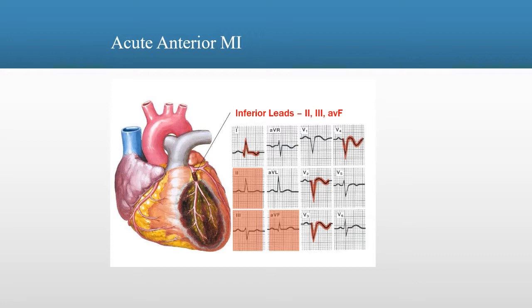Before moving on, let's look at a systematic approach of reviewing the 12-lead EKG. We will always look at the inferior portions first, then we will look at lateral, septal, and anterior. These are examples by highlighting each of the portions.